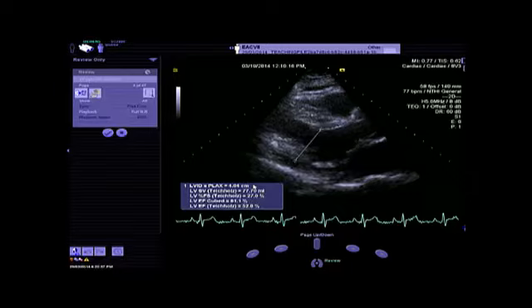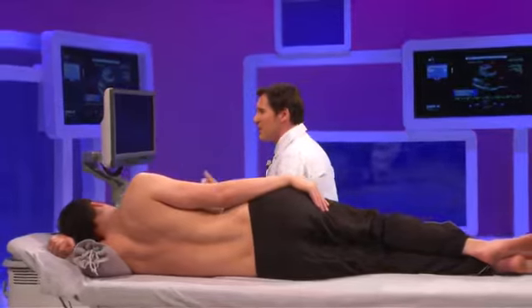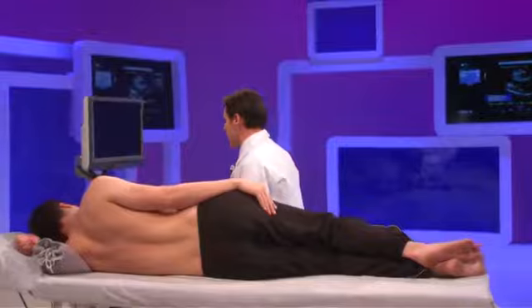And you know here we have 40 millimeters. So this means that in practice, we have a cutoff value that is close to what the American guidelines suggest as a criterion to be referred for mitral valve repair, when the possibility of repair is almost 90%, which is not the case in these patients. So what we have here is a value that is less than 45 millimeters. That is the cutoff value suggested by the European guidelines. So this means that according to the European guidelines, we can still follow these patients just clinically and echocardiographically every 6 months.